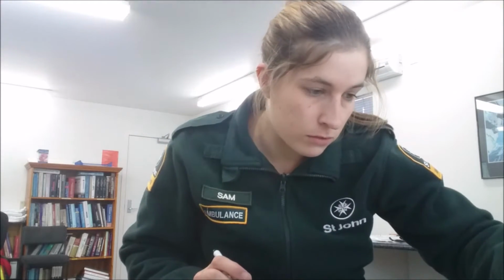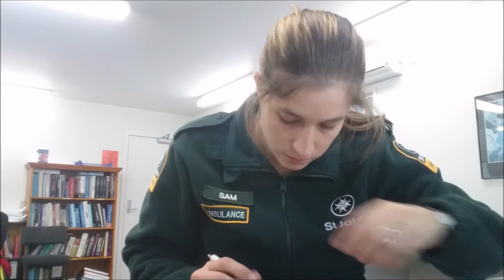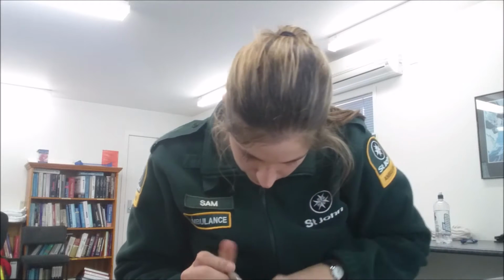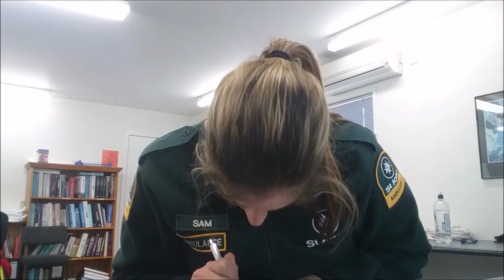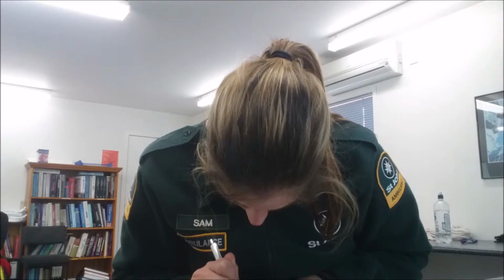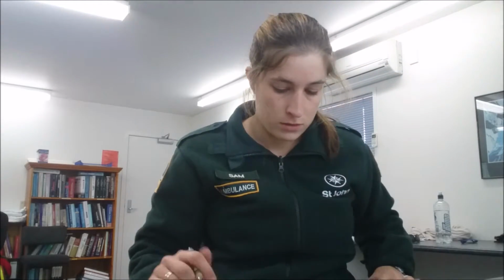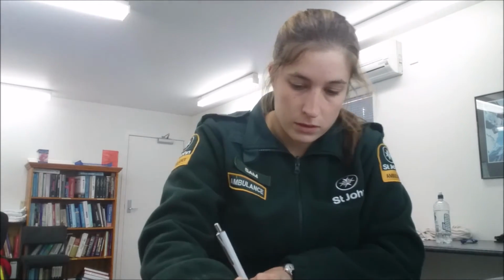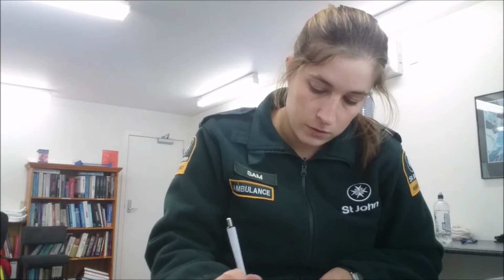I've got 1500 divided by the boxes between the R waves: 5, 6, 7, 8, 9, 10. So 1500 divided by 10 is 150. Tachy at 150.